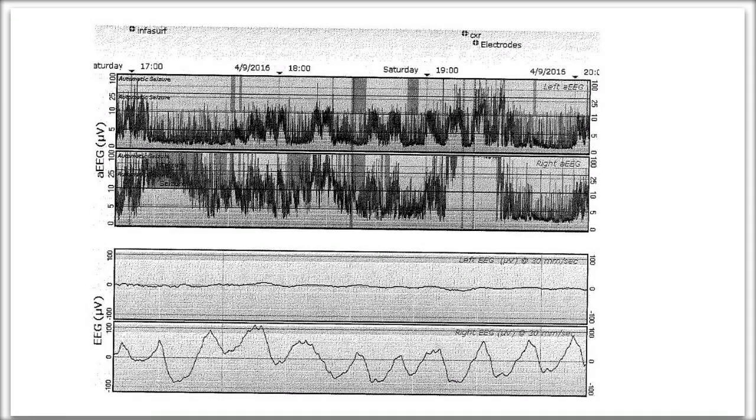At the very end of this tracing, after the chest X-ray and the electrodes are repositioned, the tracing is actually quite ugly, in the sense of pathological, where you see the lower margin is less than 5 and kind of flattened out, and then there are these occasional bursts. So this brain is very unwell, and near the end we begin to see a little bit of a shifting up, and yet we see this pattern of rhythmic activity. So certainly suspicious for some sort of seizure potentially happening, but difficult to say without knowing the true impedance.